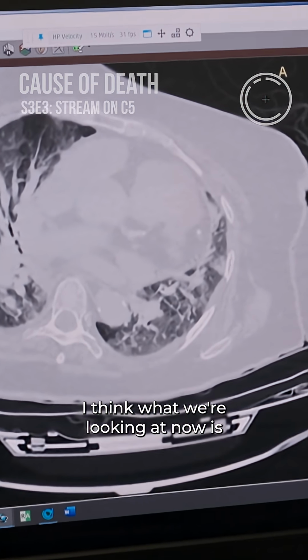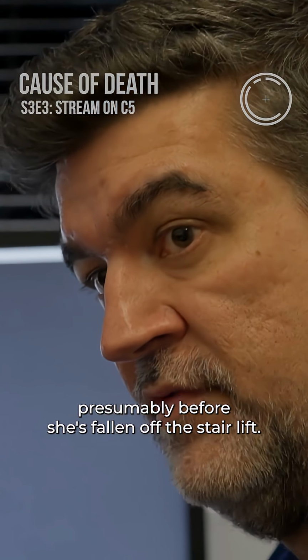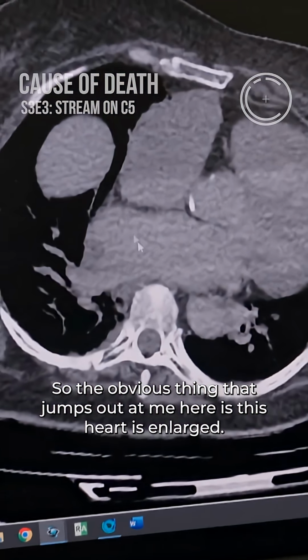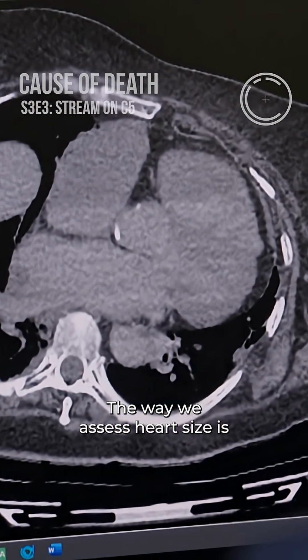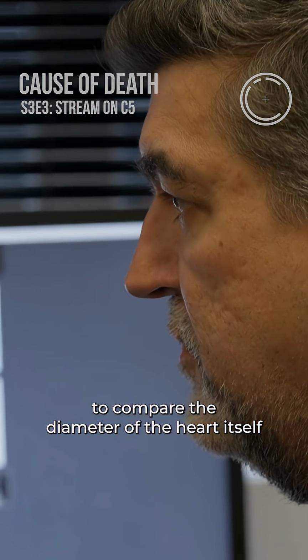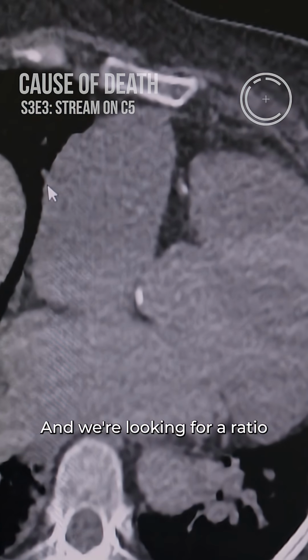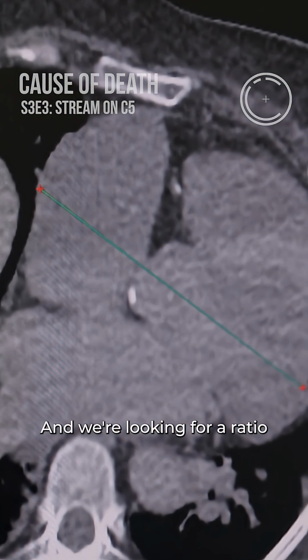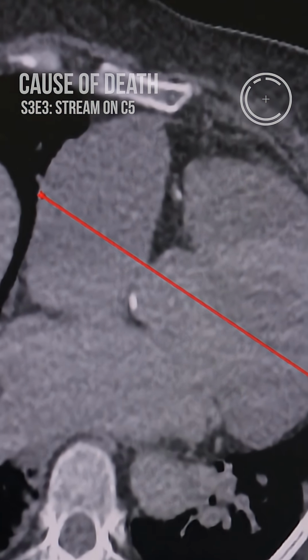I think what we're looking at now is what's happened to the patient, presumably before she's fallen off the stair lift. So the obvious thing that jumps out at me here is this heart is enlarged. The way we assess heart size is to compare the diameter of the heart itself with the diameter of the thorax. And we're looking for a ratio of anything over sort of 0.55 is abnormal.